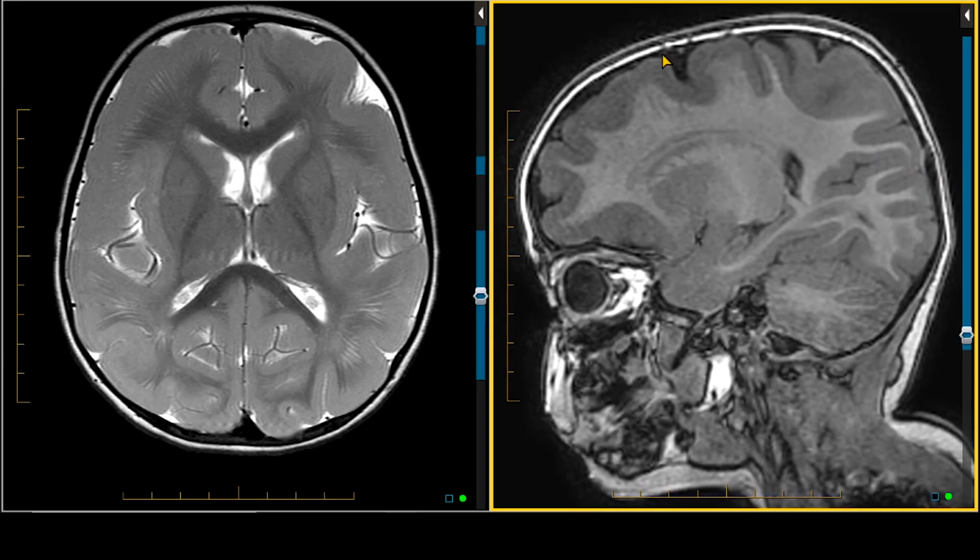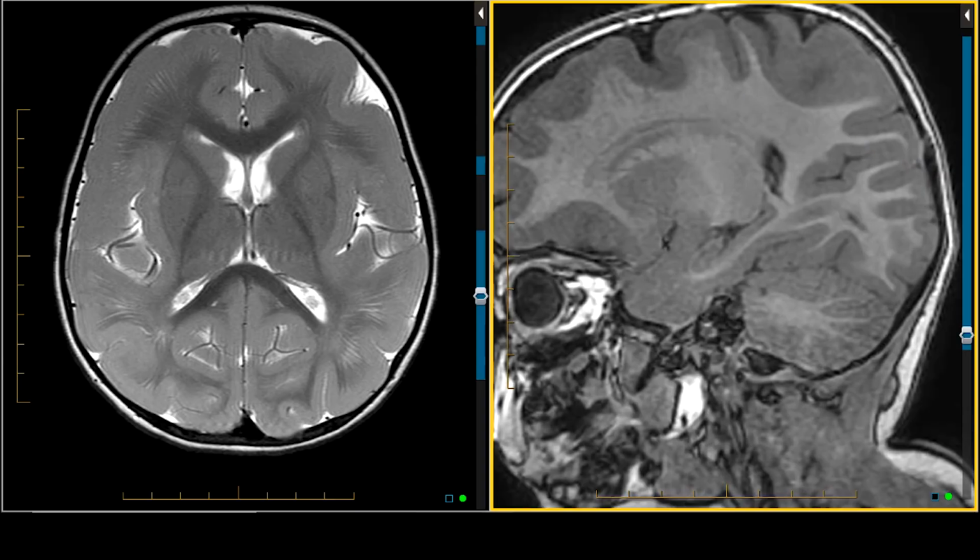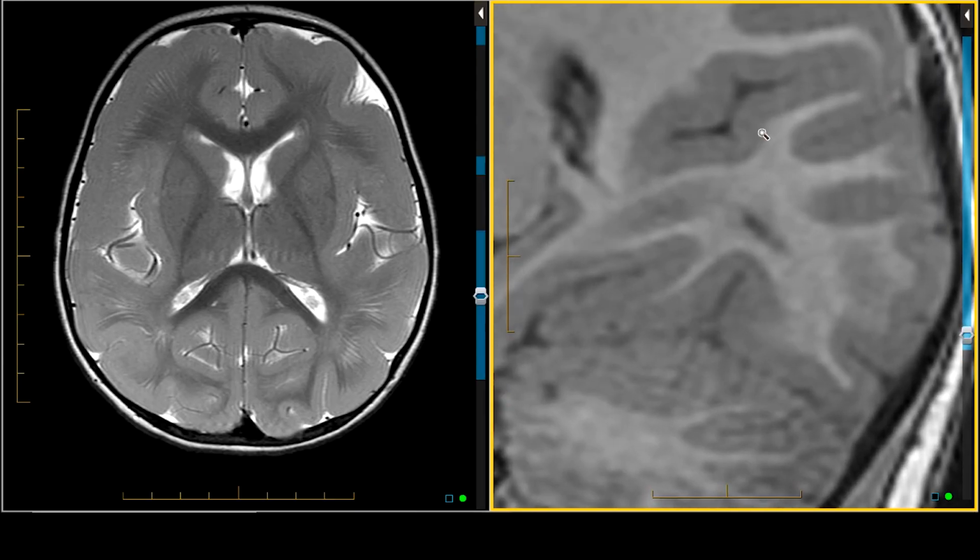Now, the one thing also that we can see well on the T1 weighted image is the nice gray matter, and beneath that we see the white matter. There's no band type heterotopia. So this is a diffuse mild Lissencephaly spectrum disorder involving both cerebral hemispheres, anterior and posteriorly, without band type heterotopia.